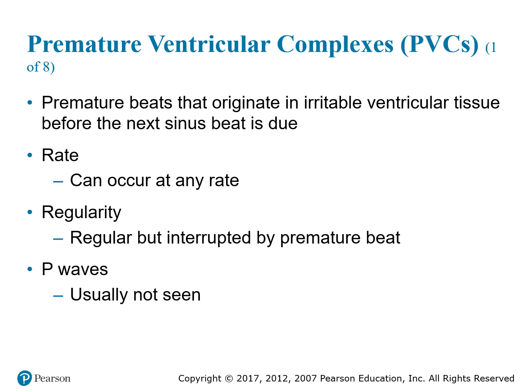If the ectopic QRS complex is predominantly positive, the ST segment is usually depressed and the T wave negative. The pause associated with the PVC is usually called a compensatory pause.